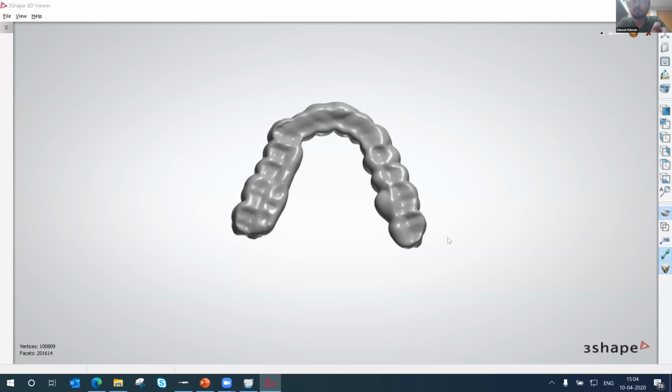The articulator settings trainer suggested that if I didn't set the pin, the rest of the design wouldn't guide properly. So Kit, you have the same question, I guess, continued. You need to set the pin as per the thickness. So I guess you can set the thickness and then the pin will guide you automatically.